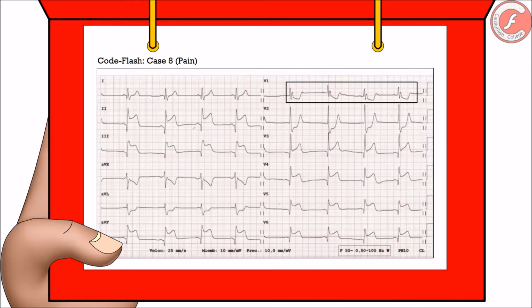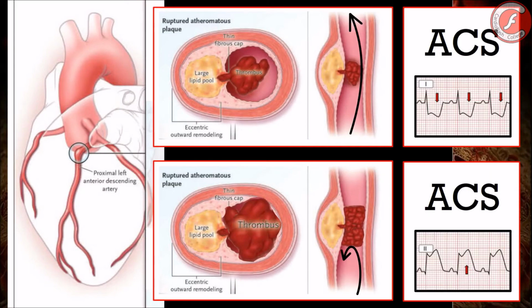We should remember that positive vectors in these leads could be the reflex of an area with necrosis in the posterior wall. In any case, we could say that the patient had an inferior and lateral STEMI, reasons for which, if primary angioplasty could not be guaranteed in a period of 90 minutes top, fibrinolysis was justified if there were no contraindications for it. But what clinical relevance does this have?